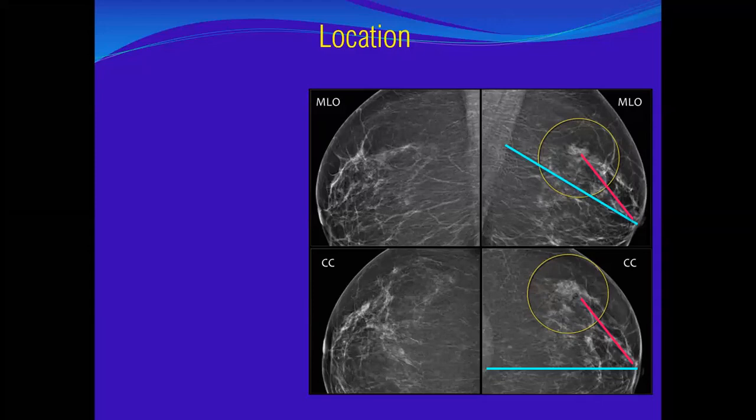On CC, it seems to be upper outer. This is the CC view. This line is at what o'clock? This is either 6 or 12. Since we are upper, we consider it 12. So this is 12, going outer to 1 from here, then 2 o'clock.